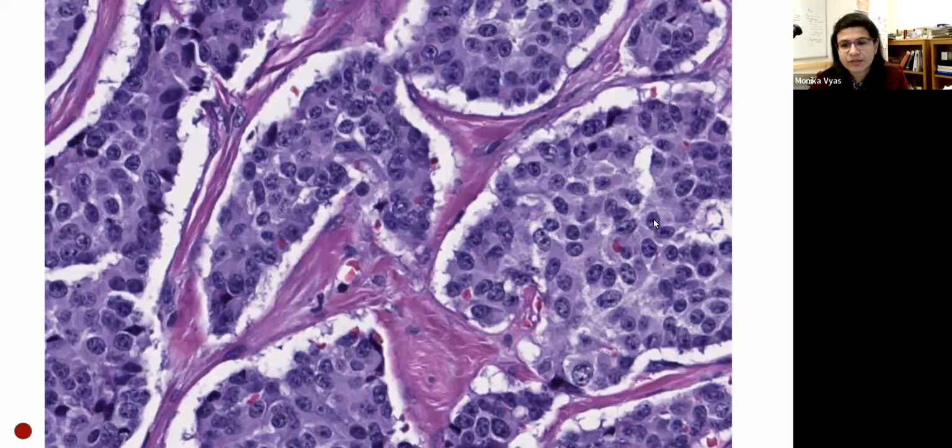And here's a characteristic example of a nested morphology of neuroendocrine tumors. You can appreciate that these are very, very monomorphic. You can see abrupt pleomorphism, which is a characteristic feature of neuroendocrine tumors of any site, actually. This is also called neuroendocrine atypia, but usually the cells are very monotonous. You can see very granular chromatin. Nucleoli can be conspicuous, but not that prominent. And then depending on the grading, you may or may not see mitosis. Usually mitotic figures don't jump out at you that easily.